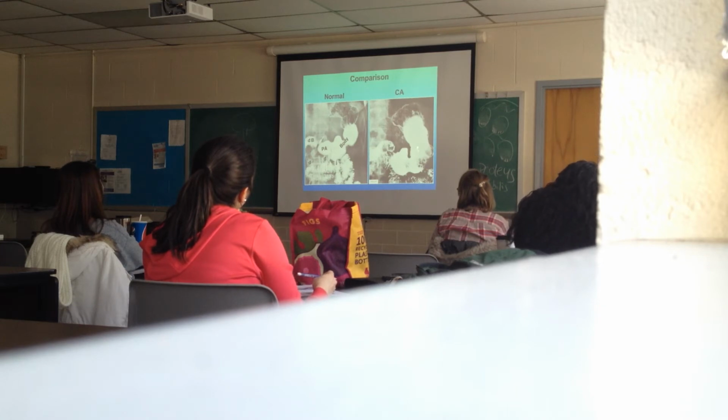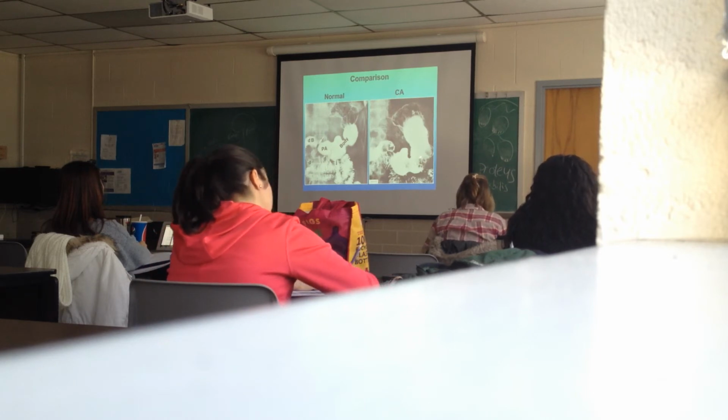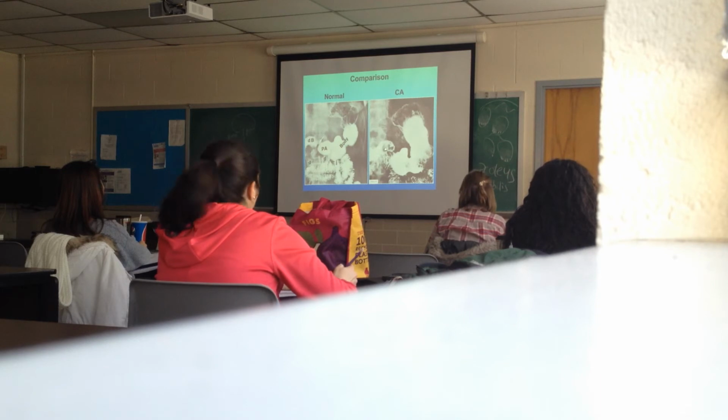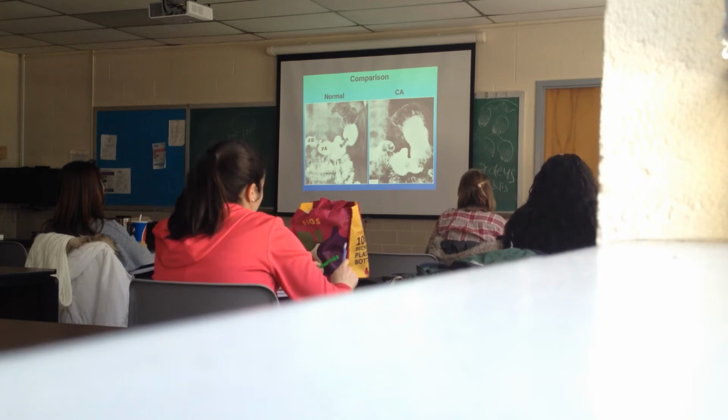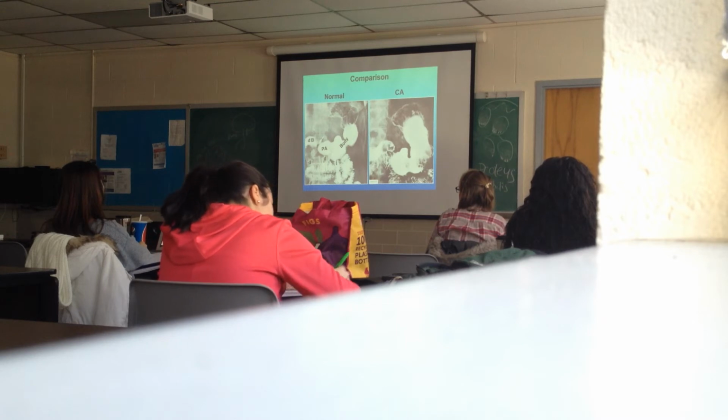Over here, towards the distal corpus, you can see there's a filling defect. That's an exophytic mass. You also see a filling defect in the duodenal bulb. Over here, the duodenal bulb is filling uniformly with barium. Here, again, you see there's something there. And again, that's one example of how a gastric cancer can present. It's not the only way, but that's one.